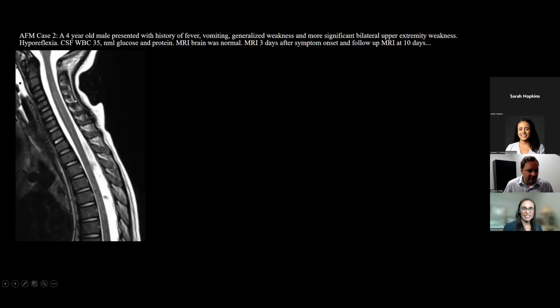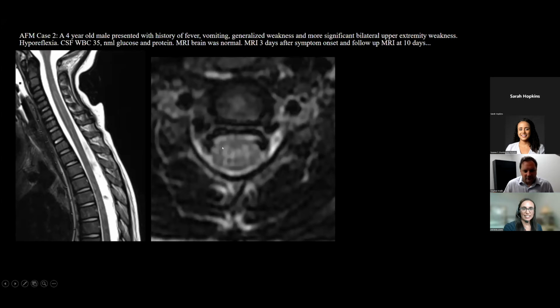So what we see here is kind of subtle. If you look at the spinal cord, this is more normal intensity pattern, and we're starting to get a faint T2 hyperintense pattern through the cervical cord, through here. Again, it's sometimes very difficult on the sagittal. It can almost look pencil-like in its intensity through here. When you go to the axials, it's a little more apparent. There is a little bit of a central gray matter H-shaped pattern here in the spinal cord.